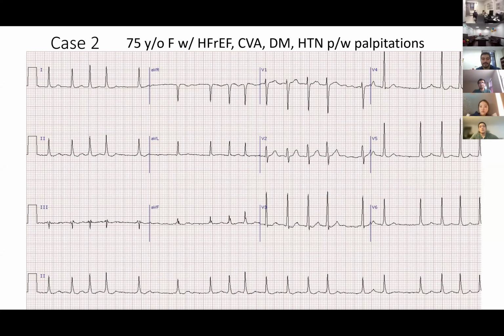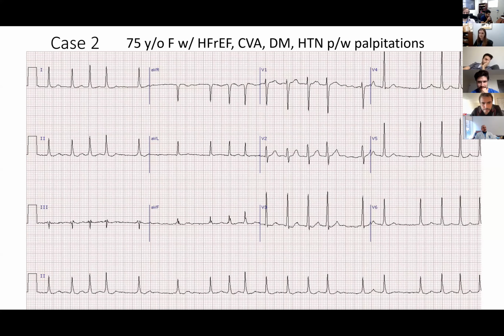First of all, in 2 and 3, there is a... Oh no, I don't see any P waves. That's important. So we'll get to rhythm. So let's go together into this.